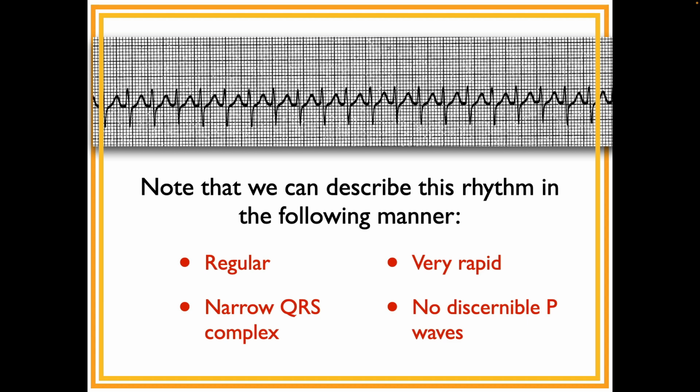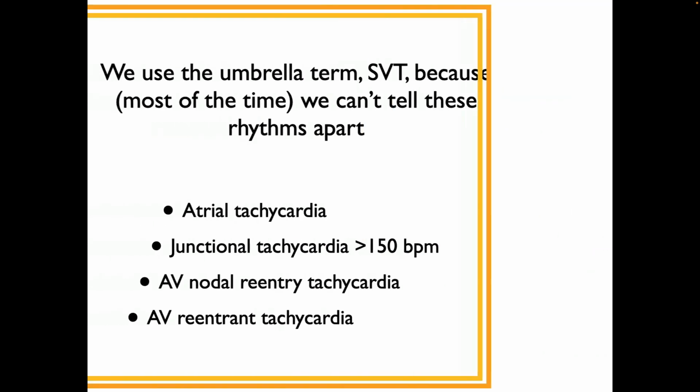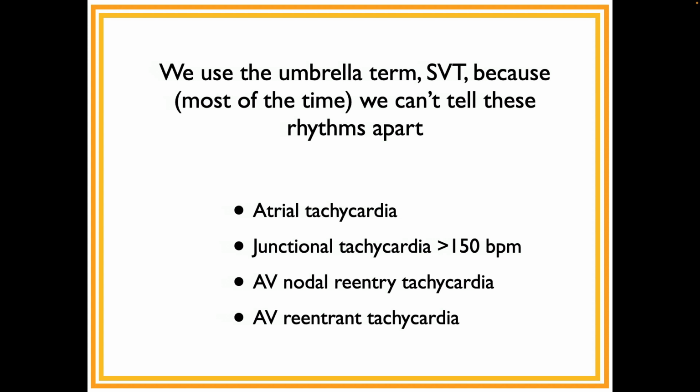Okay, so now we're going to pull it all together and talk about SVT and what it means for us. So, we use the umbrella term SVT because most of the time we can't tell these four rhythms apart. Okay, they look exactly the same.